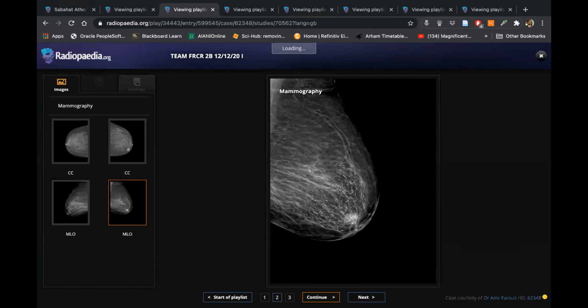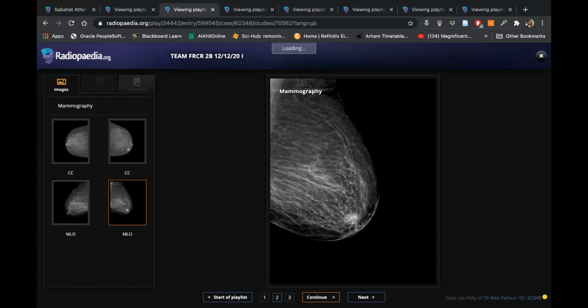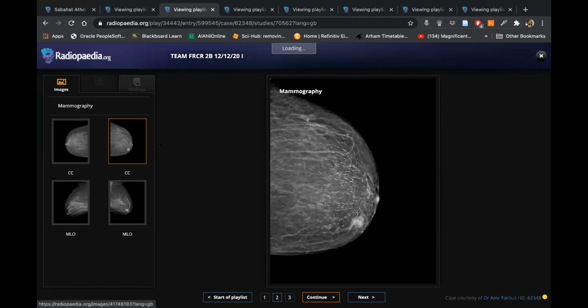But what was good is that you did not stop after saying these calcifications. This was important, okay? And this is what is suspicious. So the words which you can use for it are irregular, spiculated, suspicious lesion, okay? You can call it M4 or M5 or BI-RADS 4, BI-RADS 5, everything is acceptable. One thing which we forget to add when we are in the hot seat, although we do it every time, is comparison with the previous, right? Yes. We will always say that there is comparison with the previous. Otherwise, everything was fine. So this is plasma cell mastitis with suspicious lesion.